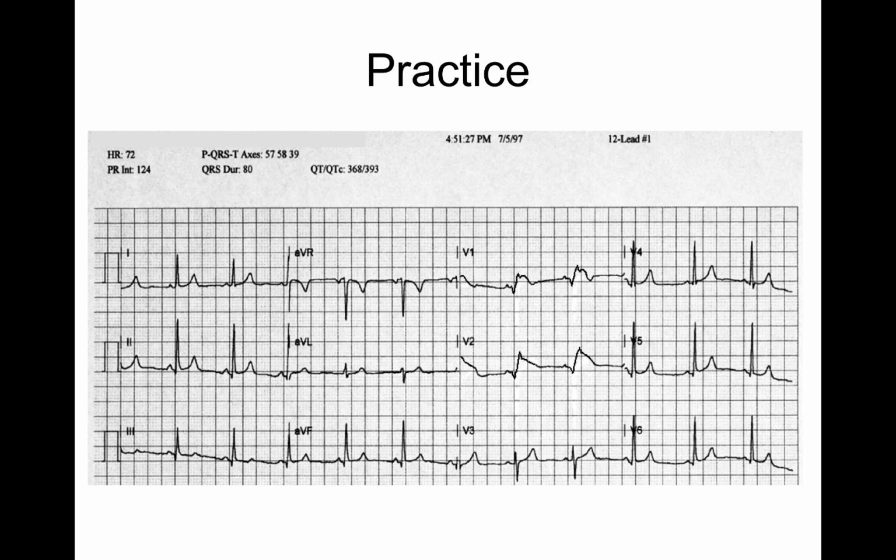This is a good EKG too. Just looking at it, see if you're good by now. Where's the heart attack at? This is your septal wall MI, V1, V2. Your septal wall MI.